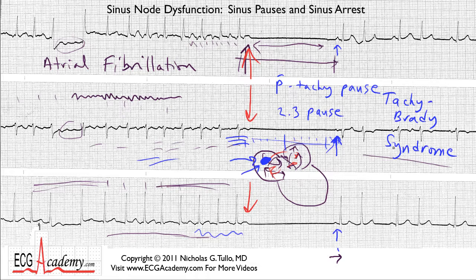Well, of course, in this case, what follows are a series of atrial premature beats, which we'll talk about. Here's a sinus beat and then a premature beat, and then you're back to a sinus beat. So you've got a lot of atrial ectopy or premature beats going on. This is all stuff that we'll cover in subsequent sections, but I wanted you to know exactly what this is, so that when you see it again in the future, you'll begin to recognize it.